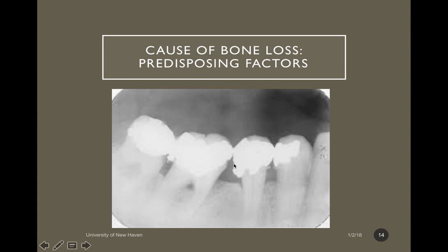So look at this giant overhang. We have so many giant overhangs between all these teeth. And then look at all the loss of bone here. We've got furcation involvement. We've got some bony defects here. There's some pretty severe loss of bone. We can also see here some calculus as well. And again, calculus is going to be a local irritant. Calculus can also be a factor in losing bone, obviously because we are trapping biofilm and pathogenic bacteria underneath that calculus.